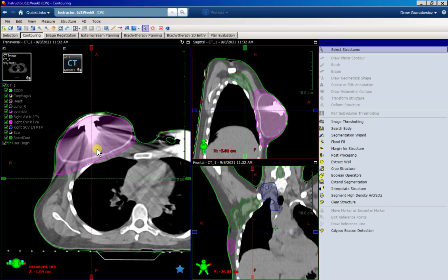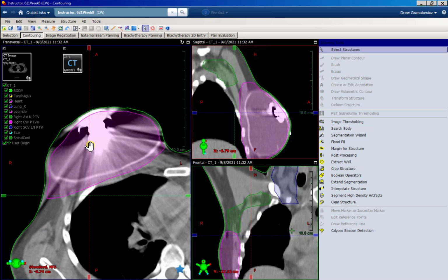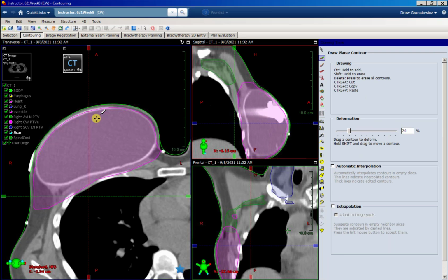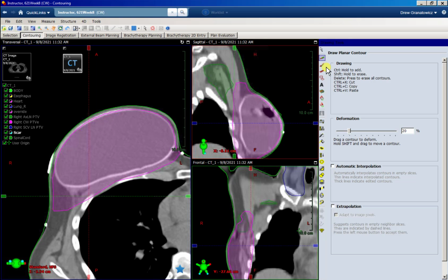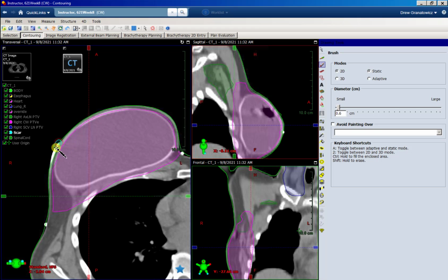Next is just a couple notes on contours. I'll have you guys complete the rest of this contour list, but to plan, I just need to do a couple things here first. So the scar, I won't do the whole scar contour right now, but you guys will need to do the scar so you have it set up for next week's plan, which will use this same data set. Usually for the scar, I use a brush, usually 0.6 or so, and I like to overdo my contour. There's really no reason not to slightly over contour this wire.